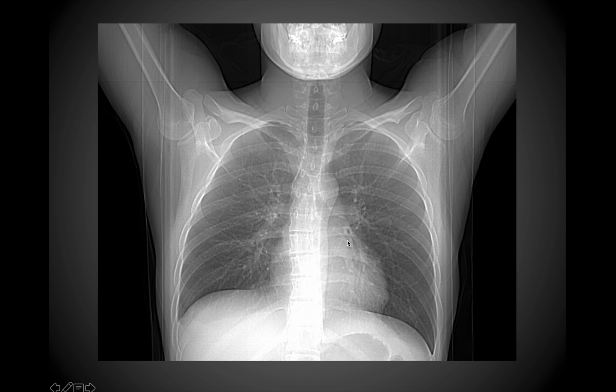So in this patient, this is a scouting image that was taken before a CT scan was performed, but it allows you to be able to appreciate some of the structures that we've talked about thus far. So again, you can see a very prominent aortic knob located right there, and then obviously the left border of the heart right here, so it's going to be located next to the lingula. Left lower lobe down here.